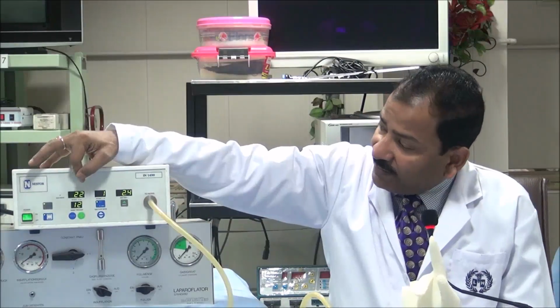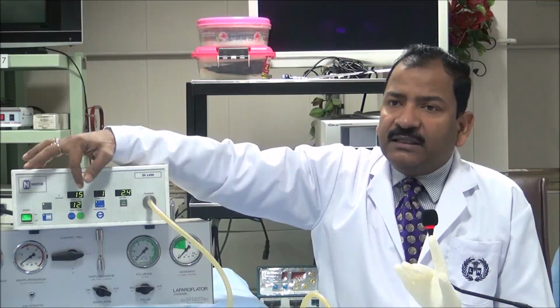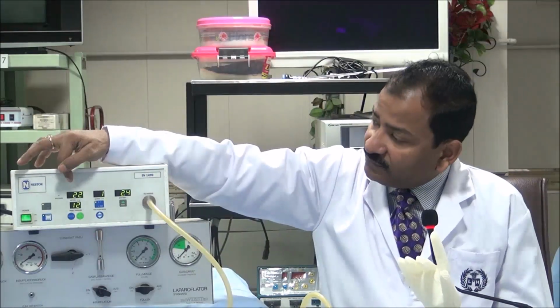Yes, due to the resistance of the gas flow through the small eye of the Veress needle. So this principle you should understand how it works. And here now you can see minimum is 0. But once little pressure will form, then this 0 will not come.